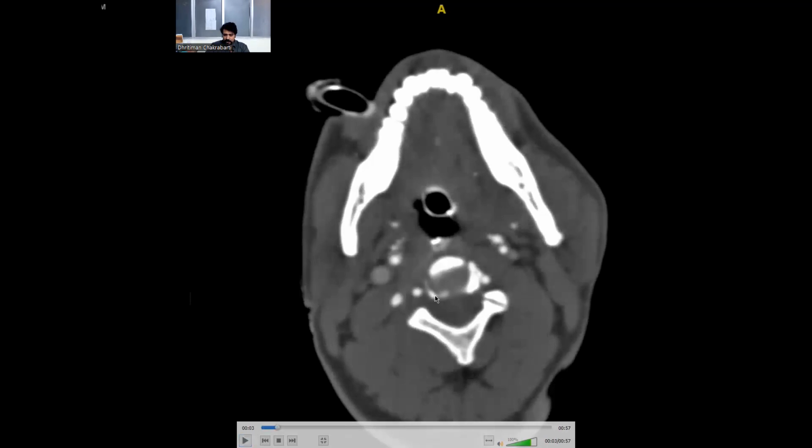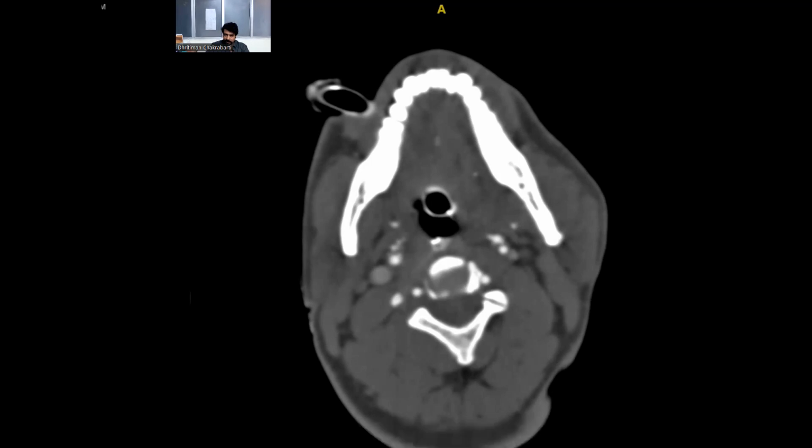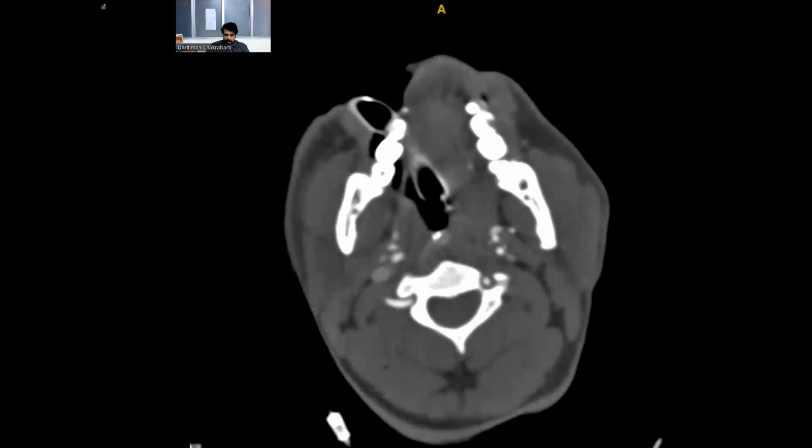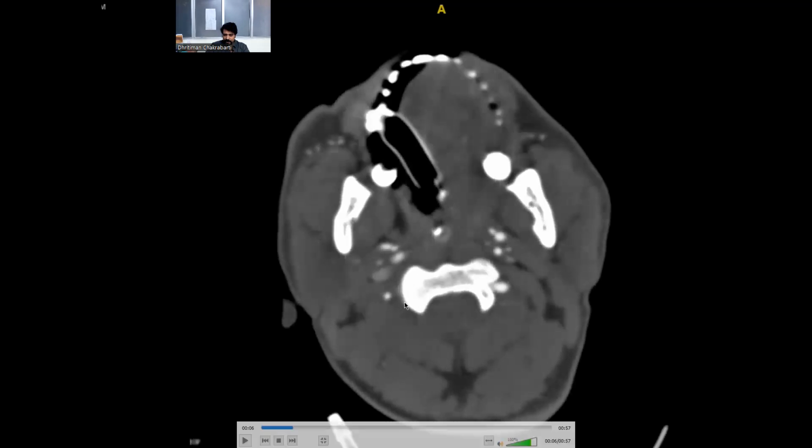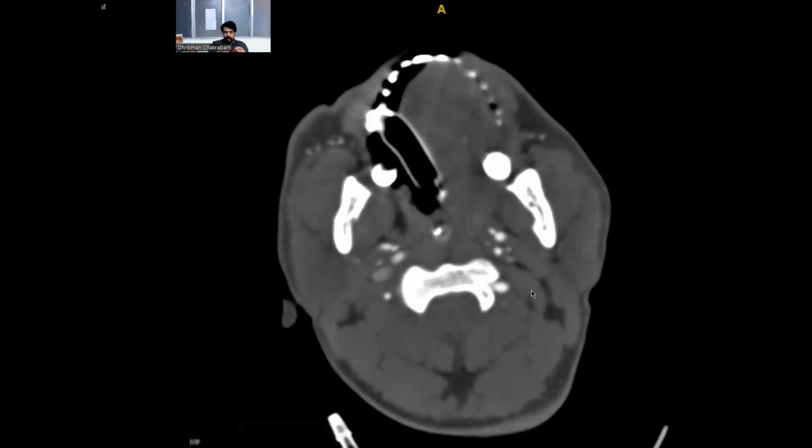Are you able to notice? These are the two points, which are the two vertebral arteries, the foraminal portion of the vertebral arteries. Now you can see it is going out. After this, the video will slow down a little bit. You can see how it is going out, both the sides. It has gone out, and then it will loop back over the arch of the C1 vertebra.